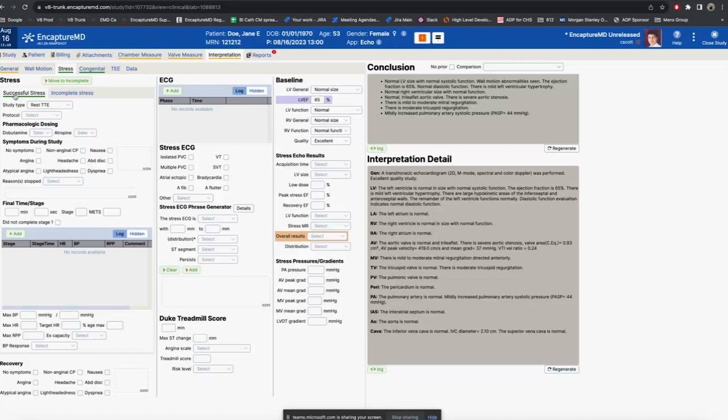For a child, it's done using something called a Z-score, which is a more accurate method that has had every single measurement tested on normal and abnormal children over the years, and therefore isn't just divide by a certain number, it's adjusted for each measurement based on a normal distribution, which is a more powerful tool. So if enough people want to see that today, we can do that.